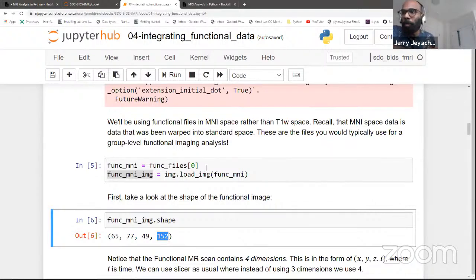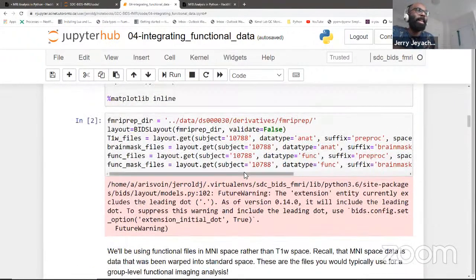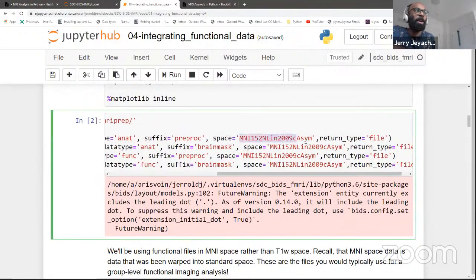OK, I will. Yeah, so it's empty. Okay, so that may mean that you might have typed this thing right over here. It's easy to get wrong. You might have mistyped that one right there. So make sure that the capitalization matches, that the entire little string over here matches exactly the same.